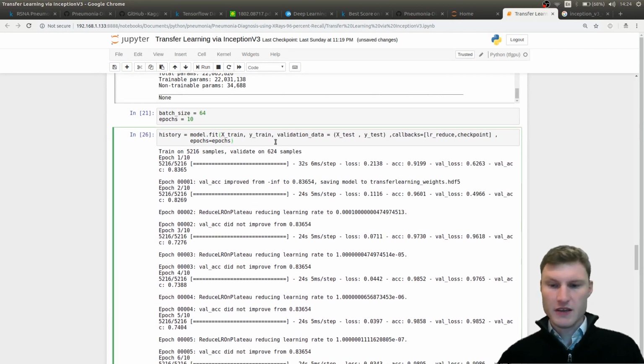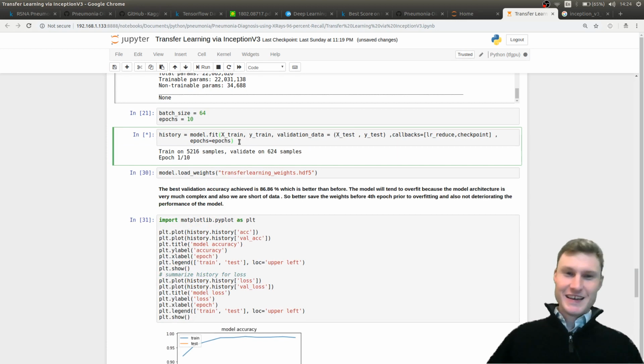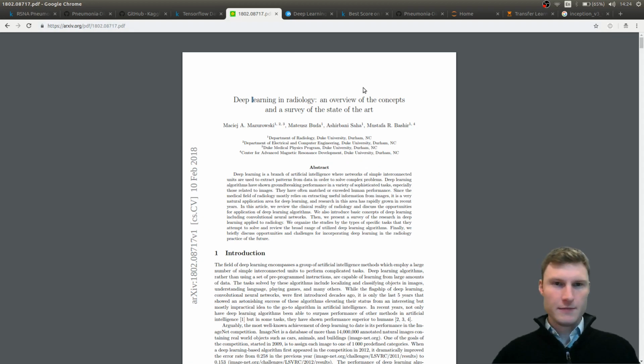And I know this will take a couple of minutes. I hear in the background my workstation, the vents turn on, and it should say that the first epoch, yes, it's training. And I believe I will pause the video quickly. No, actually, I'm going to show you some other things.